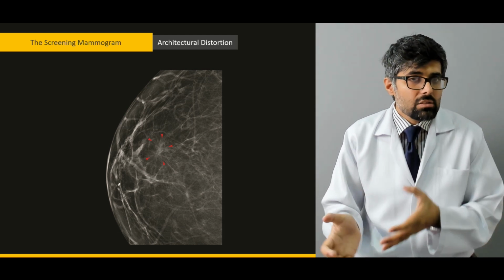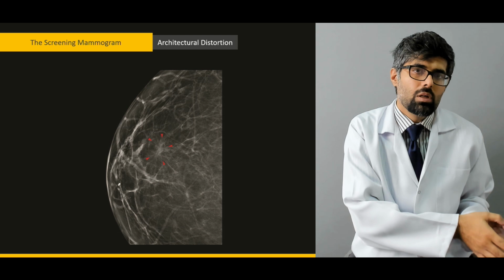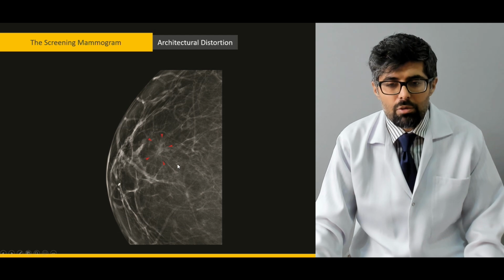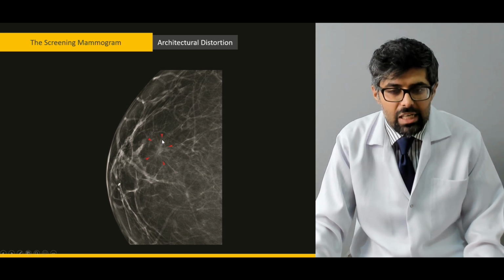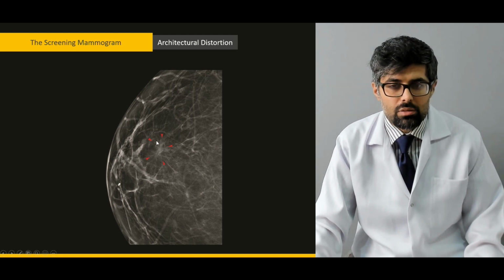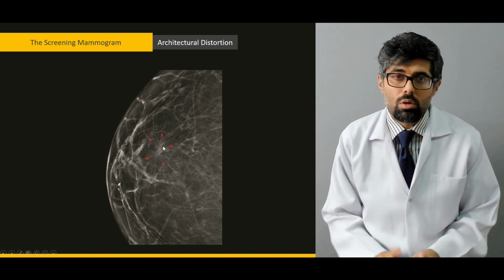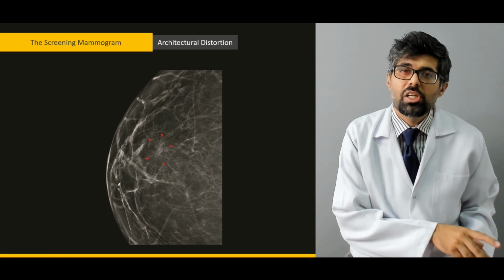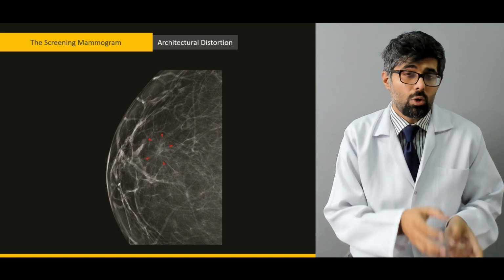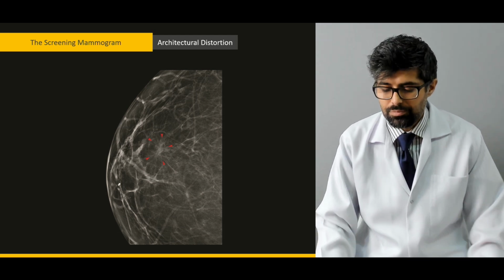disrupted, and this results in the dimpling of the breast tissue in the physical exam, especially those architectural distortions which have a focus and have stellate appearance with spikes protruding out. This kind of projection, this kind of distortion is especially suspicious of having a malignant nature. So, not only developing densities are noted along with calcifications, but also the structural distortions.